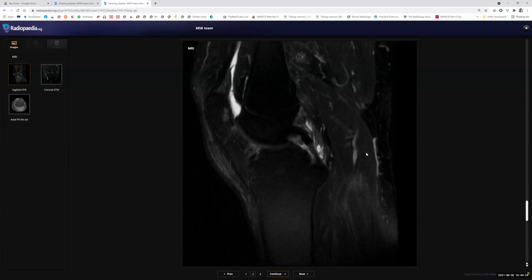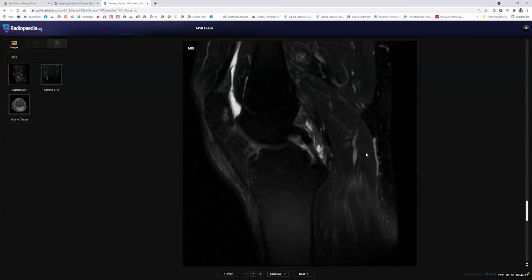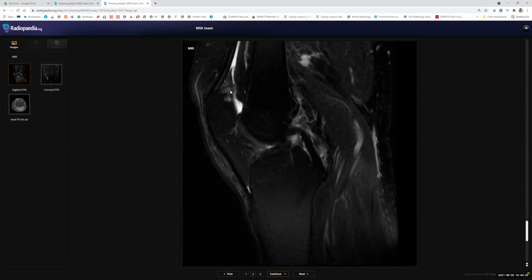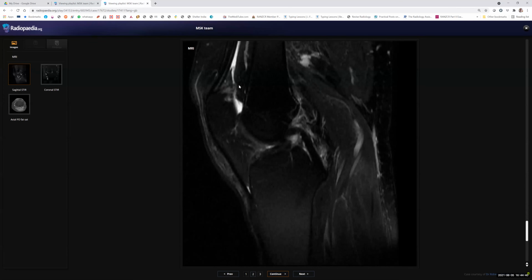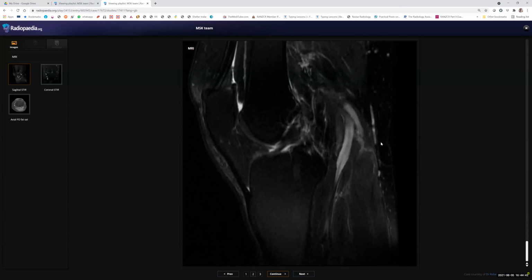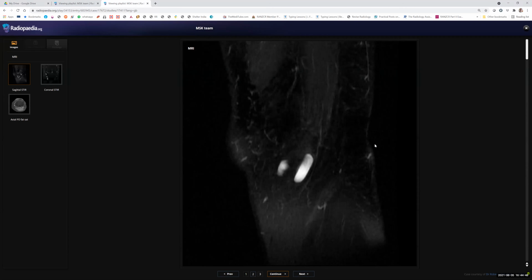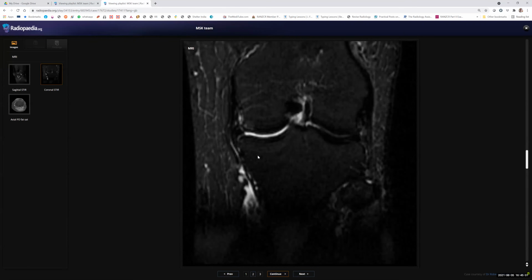You can ignore that. There's also bone bruise and edema seen in the patella. Actually, this is some, you ignore that. Can I see the ACL and PCL please a bit slowly? You have to concentrate on the history given. The history given was posteromedial knee pain, and the examiner told you that the ligaments and the menisci are normal. Okay, posteromedial pain.